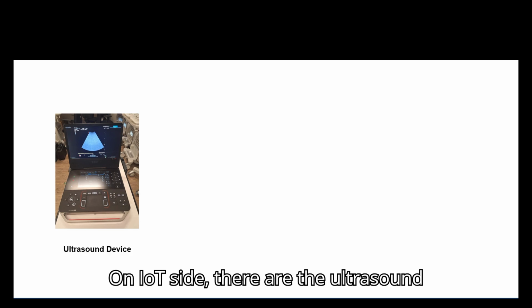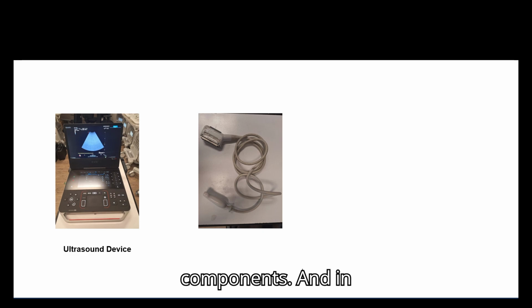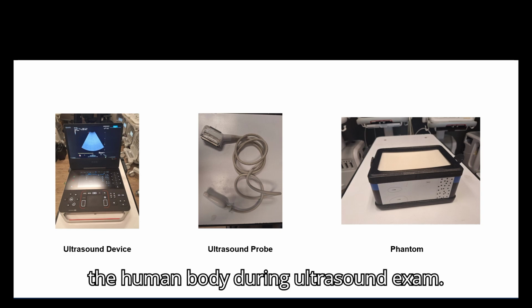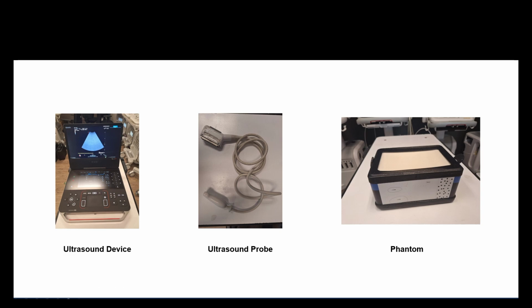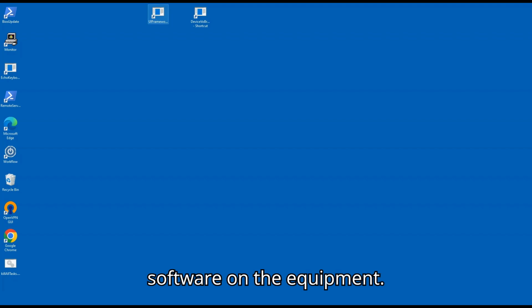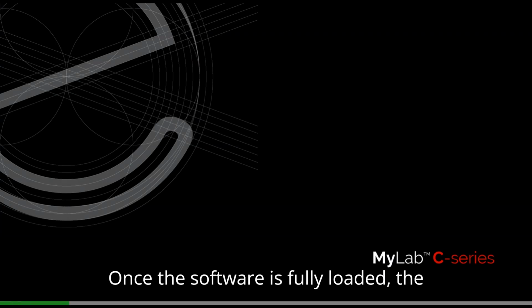On the IoT side, there are the ultrasound device and the ultrasound probe components. In addition, there is the phantom to simulate the human body during the ultrasound exam. For the demo, we run the ultrasound software on the equipment. Once the software is fully loaded, the Start Exam page appears.